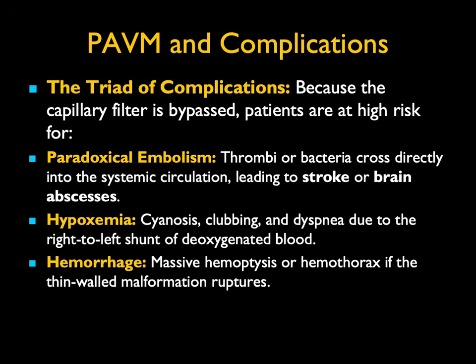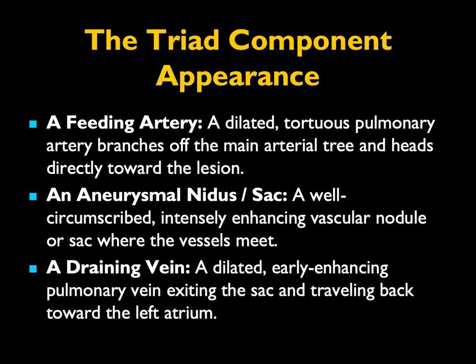Triad of complications: paradoxical embolization, hypoxemia, and hemorrhage. So PAVMs are typically treated before patients get any of these complications. Again, from an imaging perspective, the feeding artery, the aneurysmal sac, and the draining vein are all things we look for to make the right diagnosis.